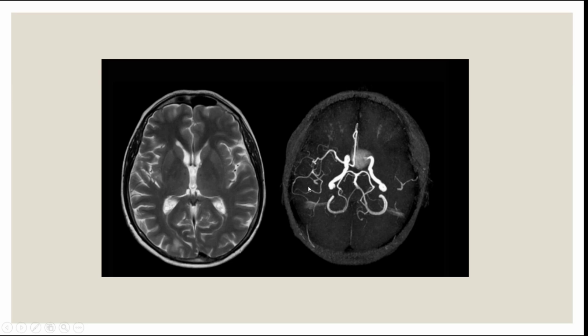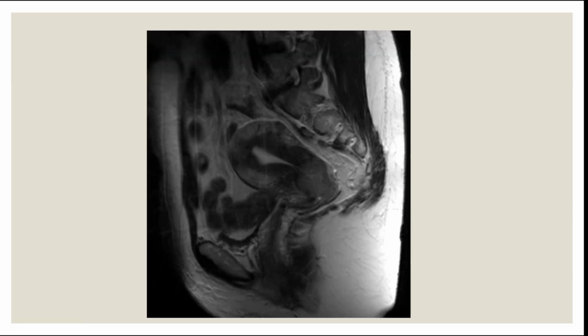And to the right, this is the MRI angio, where you can see the vascular system. So, can you please describe this image for me? Now we just have a few images, and these are random images also from your questions, from the pictures that you have. And I promise you we're going to end. We're almost ending. So can you guys try to describe this image?